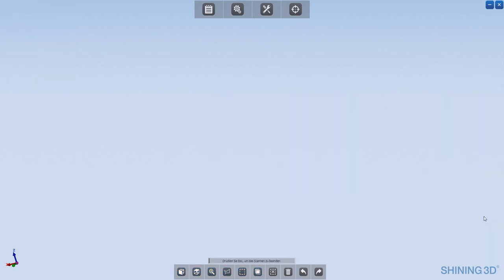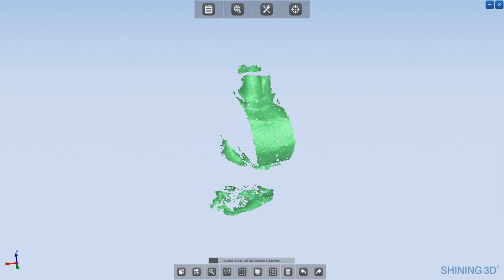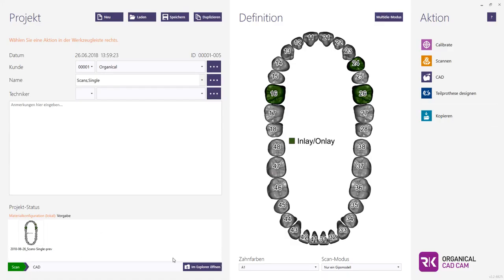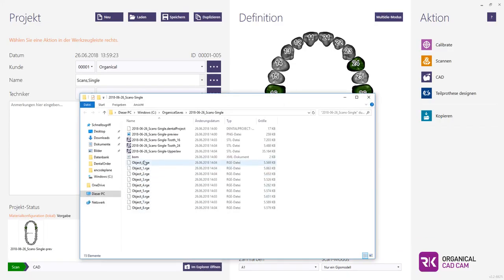That's it. Is it totally clear? Now I think it's clear for the scanning process, and even though inside here we have tooth number 2,4 and tooth number 1,6, when I load it in exocad later, he doesn't recognize that I scanned this as an inlay. There will be no problem. That's absolutely perfect. Because my question would have been, what if you do not have to edit an inlay? What if you have to edit a crown, for example? But you told me now that you can. Okay.